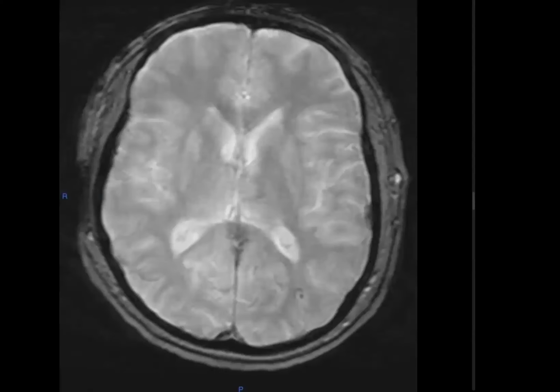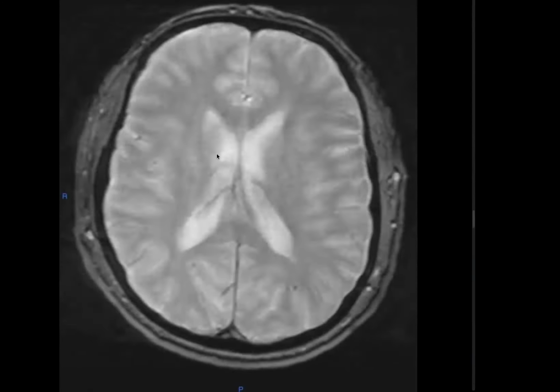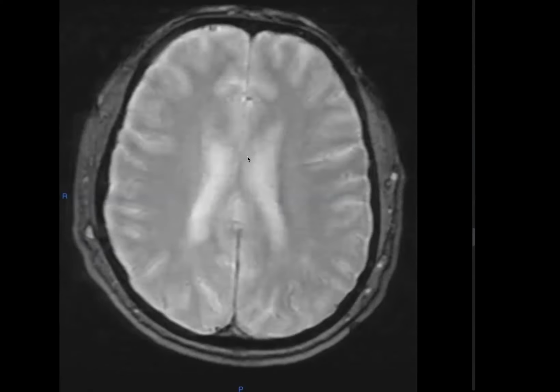Yes. But this is a common way of testing it. They start you with the unusual sequence. They might actually start you with here, and you just start saying, and then you're expected to see this, and then go back and try and work out where this is coming from.